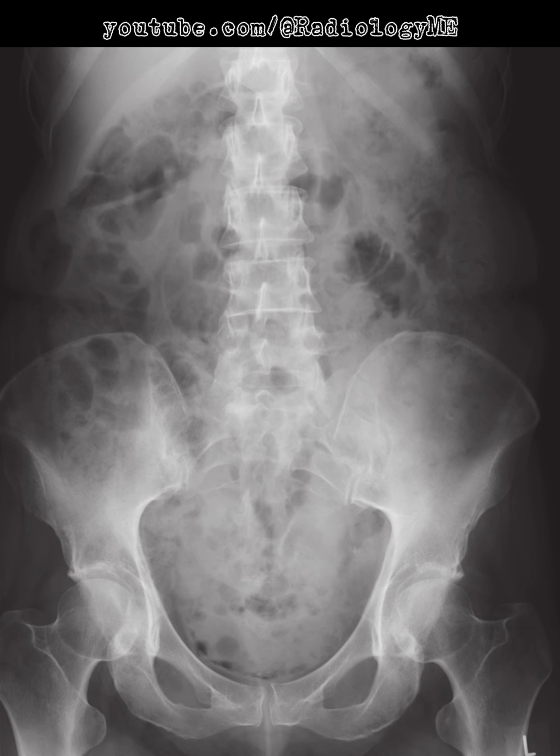Given the patient's known history of diabetes mellitus, a more likely diagnosis in this scenario would be emphysematous cystitis. This condition is typically seen in older patients with diabetes and can range in presentation from mild urinary tract infection symptoms to severe sepsis. The appearance of gas within the bladder wall is a hallmark feature of this diagnosis, but it is often subtle and can be missed on plain films.